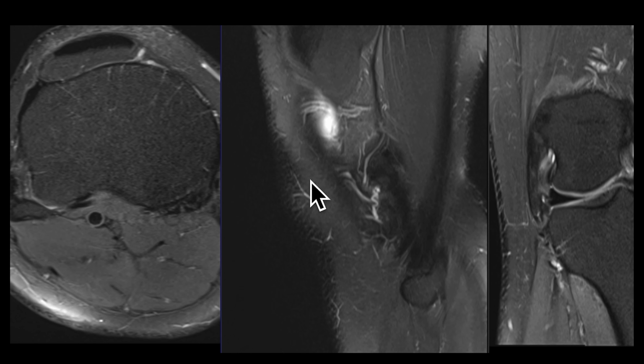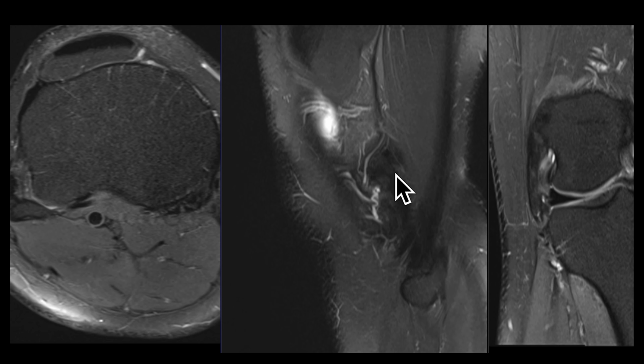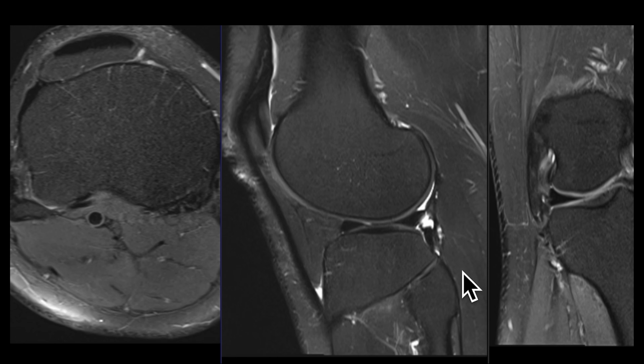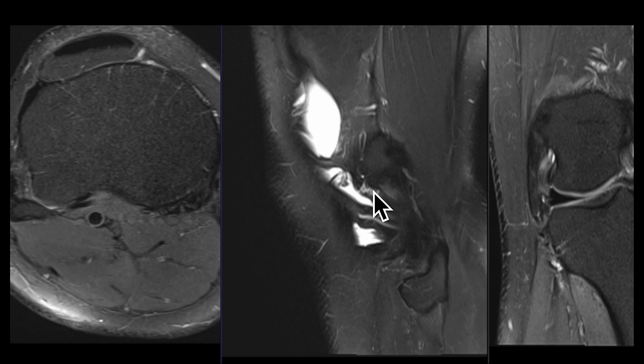The only plane that wouldn't be affected, or the only sequence that wouldn't be affected, is this T2 weighted sequence. But of course, we're in plane with the tendon, so it can be very difficult to see it. So if you try and follow this tendon up here, you can see here it's still dark signal intensity, but then here you get partial voluming and it blends in. So just to remind you that magic angle artifact means that you should have a higher threshold for calling a popliteal tendon tear. You want to see edema that is extending towards the muscle belly. You want to see irregularity or a wavy appearance to the tendon before you call it a tear, just based on the signal characteristics alone.